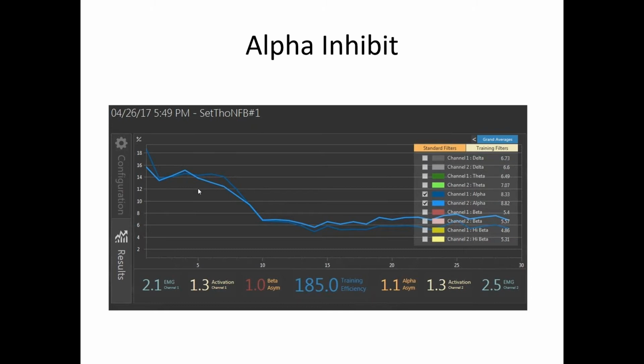If you look at people in a QEEG, every time they go into that alpha state, just before that, they start producing more beta harmonics. You'll see it in fuzzy beta lines if you're looking at the trend screen. And then you'll see more restlessness. You might see a little bit more body movement. So you'll see gross movement in delta and theta.